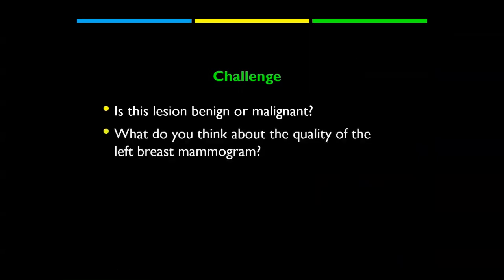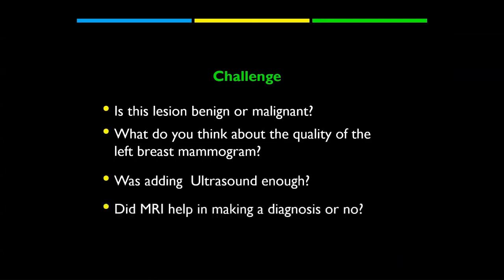And what do you think about the quality of the left breast mammogram? Was it a good mammogram, or do you think it was of a very low quality? And was adding ultrasound enough or no? And did MRI help in making a diagnosis or no?